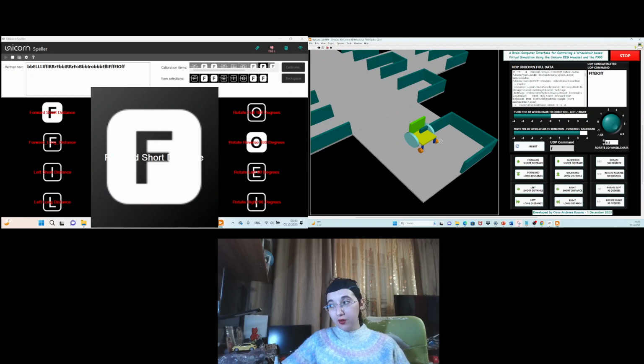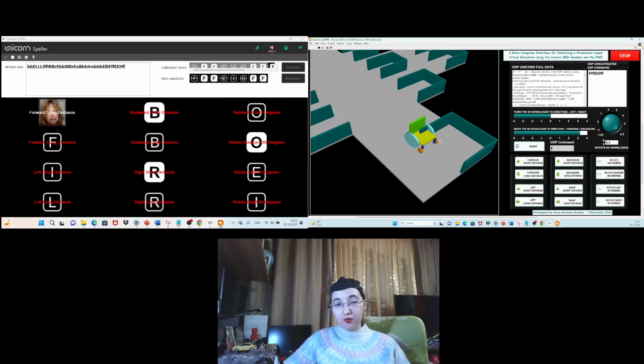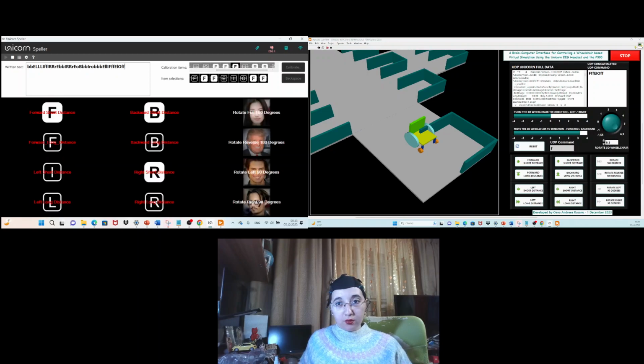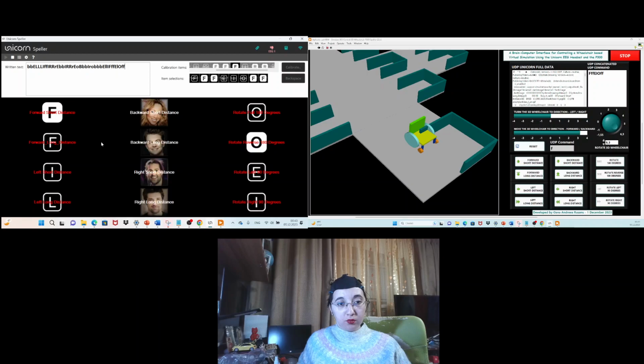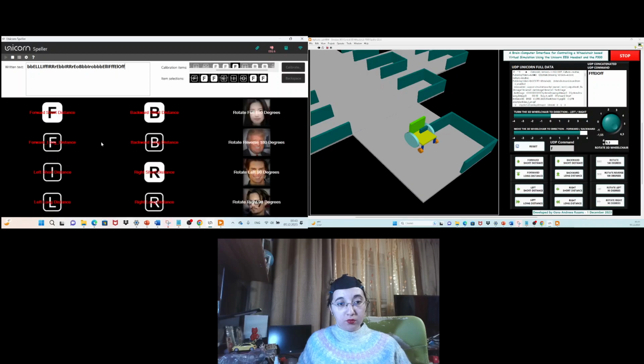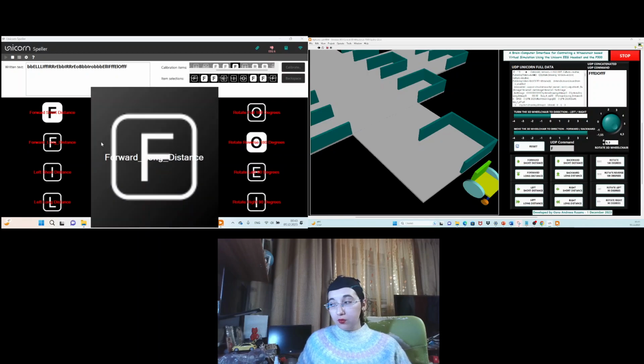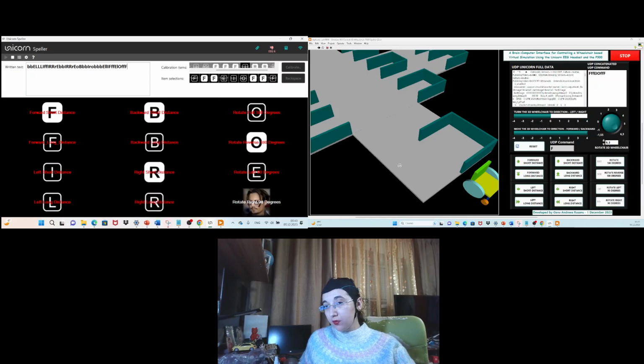Oh, it's okay, but it was a collision. I should check again the commands. I don't know which is the next command. So this one. Rotate right.